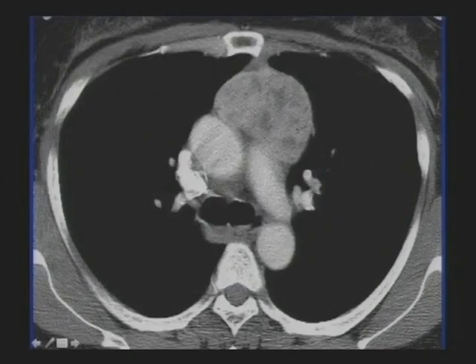There it is. Anything characteristic about that? How is this different than in thymic tumors or germ cell tumors? Well, it looks very high density. It's enhancing quite avidly, and then you have these cystic components. And if I gave you a non-con, you would also see that it was high density in the non-con, which can be very helpful. This is a thyroid goiter that was projecting down into the mediastinum. And that's most helpful. Non-con CT, high density, intrinsic high density, and then this sort of patchy heterogeneous enhancement like this.